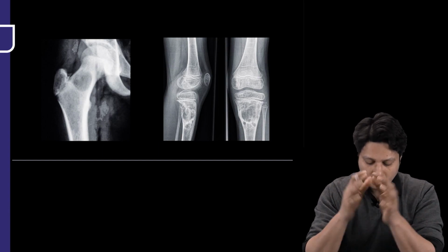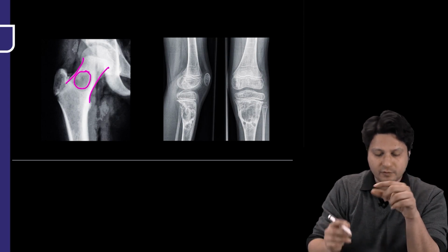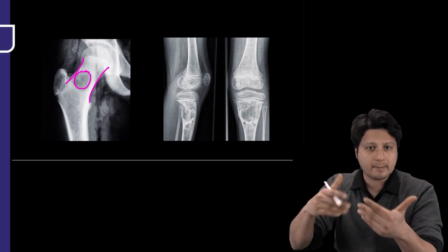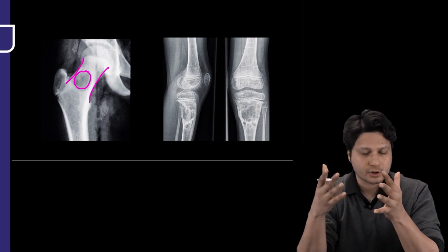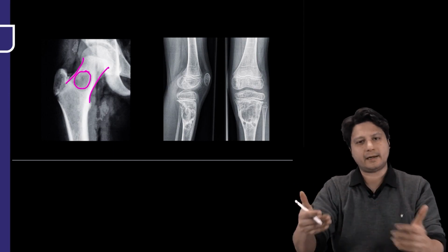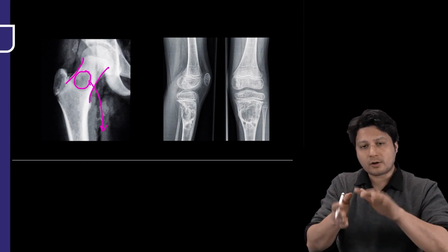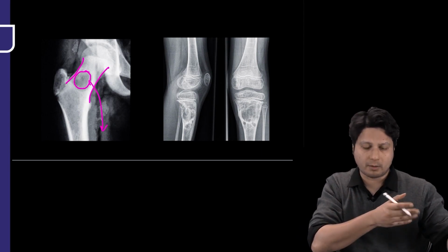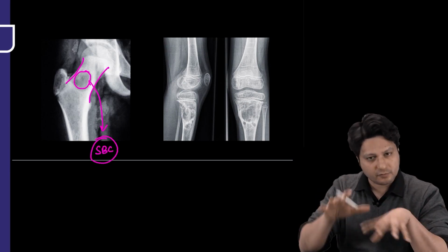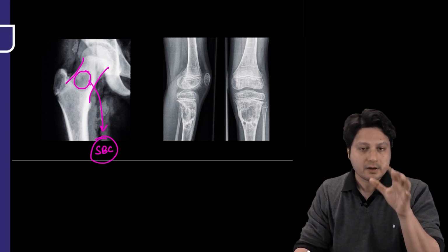All right. So if you look at this metaphyseal tumor, here we have a cyst which is well located within the confines of the normal bone. This is the kind of cyst which could remain asymptomatic for a long duration of time. Rather, it could be an incidental finding following a slight amount of trauma. So this is the cyst which you are going to compare with the theory where we have talked about it. So it is a simple bone cyst. All right, a clear cyst within the confines of the bone in the metaphyseal region, not leading to thinning out of the margins, without any septations.